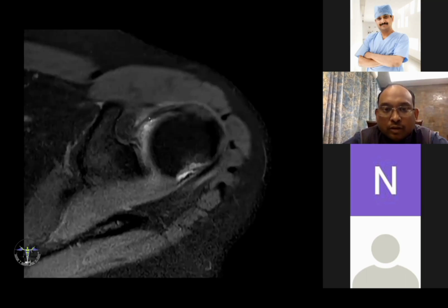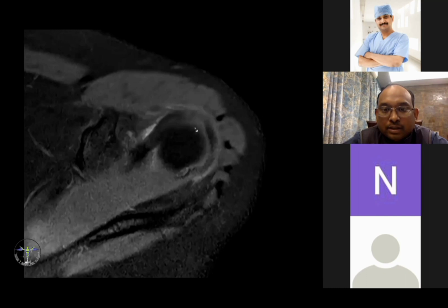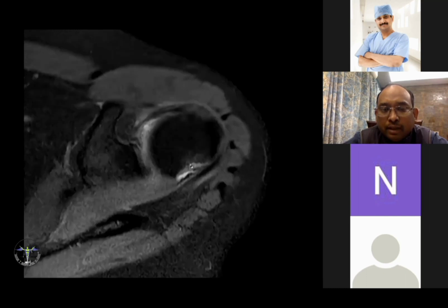So this is the coracoid, and this is above it. So actually, the defect has started from here. But in our day-to-day experience, a lot of these things depend upon the positioning and the plane which we take. So by eyeballing, we can say very well that whenever it is a posterior superior defect, it becomes a Hill-Sachs.